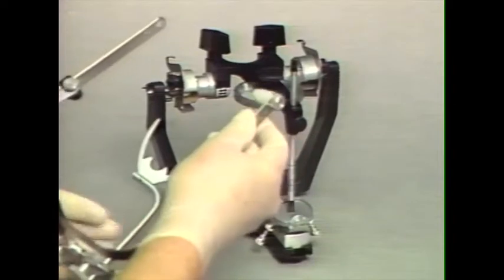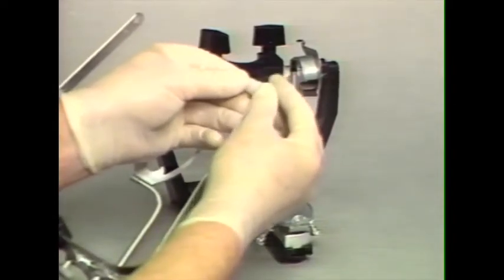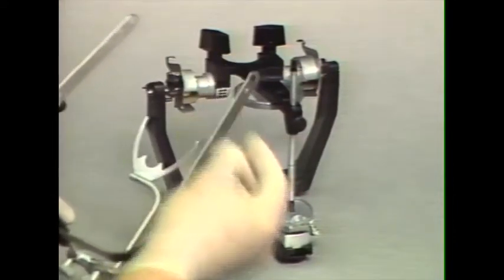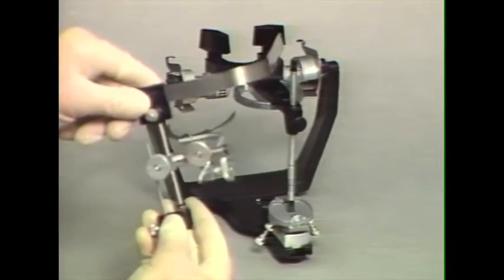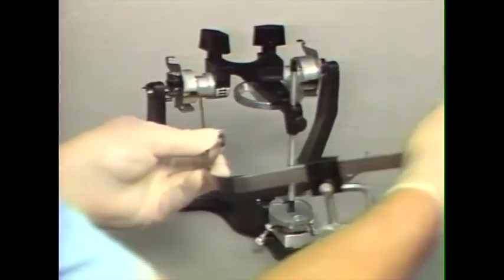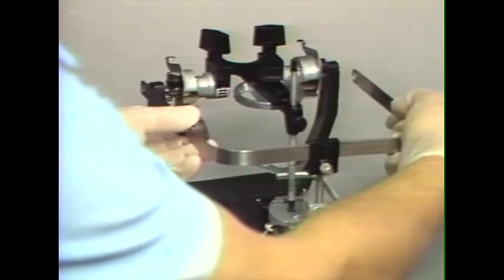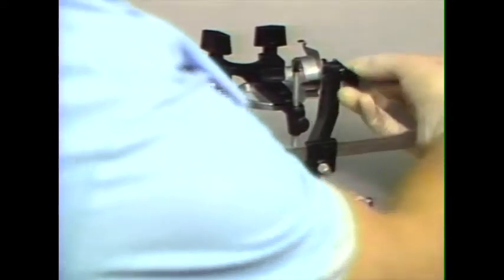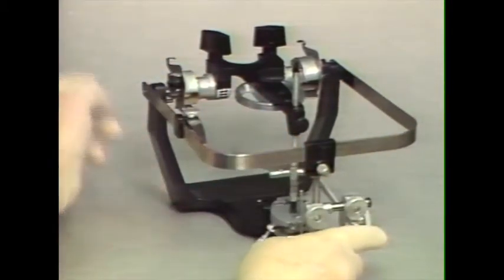To use the direct mounting, we need to remove the ear rod and attach an anterior elevating device onto the anterior vertical rod, and then spring the facebow apart and place it onto the condylar axis of the articulator. It snaps into the second hole on the side arm of the facebow.